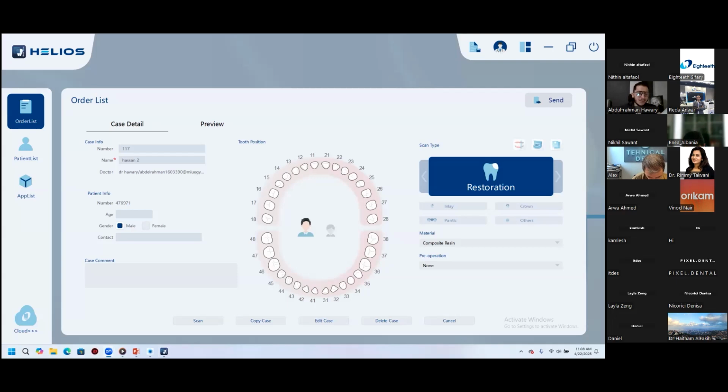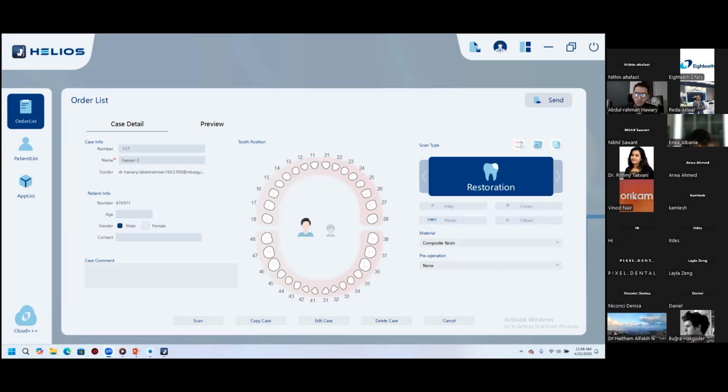Most scanners on the market measure the scanning depth from inside the tip, because based on your manipulation of the scanner, you could include your area of interest inside the tip and gain an extra 4 millimeters. So if you calculate it from outside the tip, the depth of scanning would be 16 millimeters, but based on your manipulation, you could reach 20 millimeters.